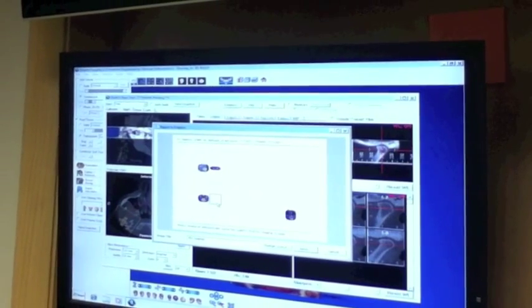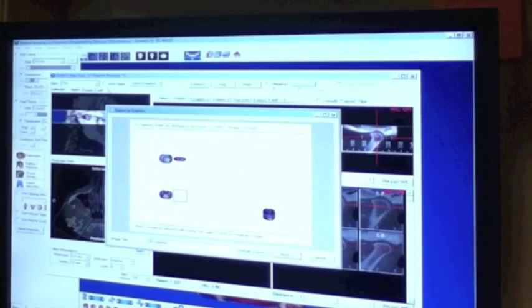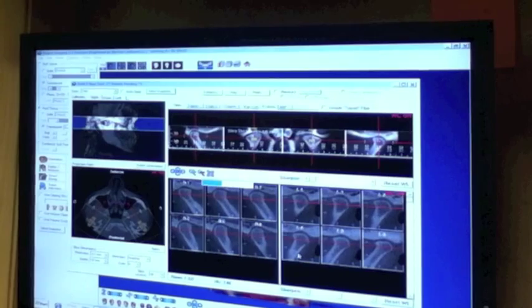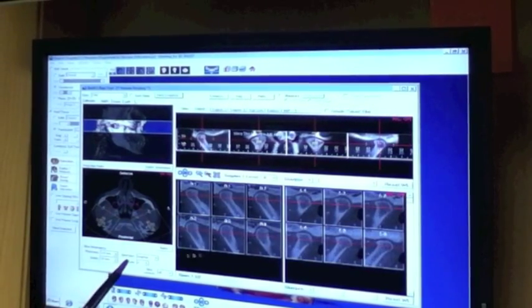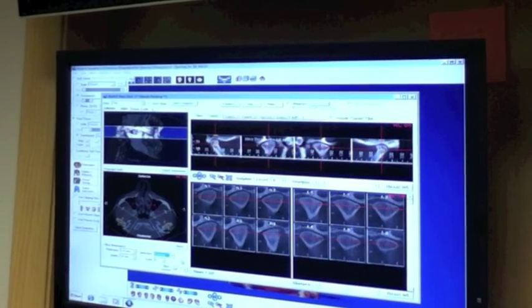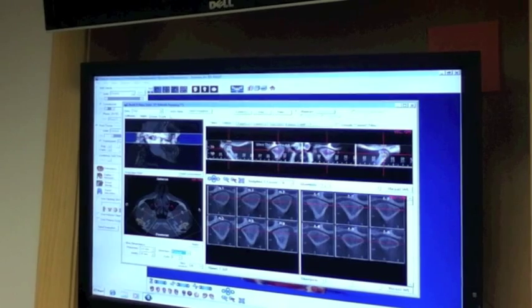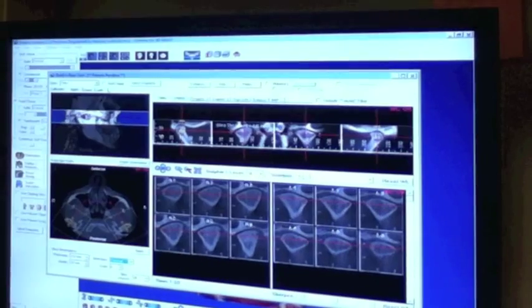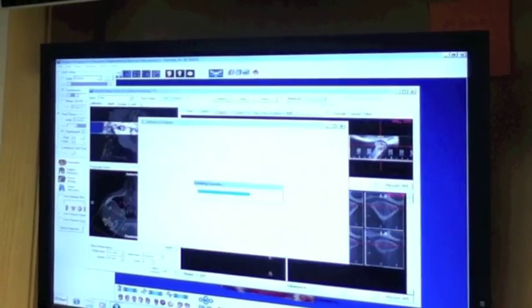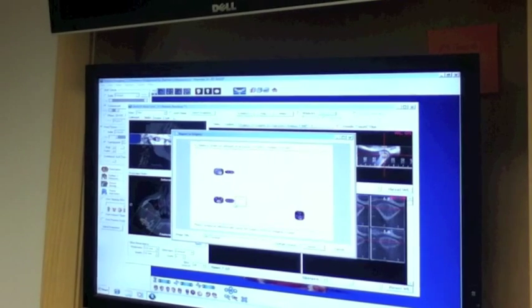This one will need to go next to the hard frontal. The 6th row down, the second box over is TMJ sagittal. After that save, you'll switch the direction of the condyles to the coronal view. And then it will be the same process of moving the yellow until you get the best picture. And then send snapshot, save to Dolphin layout, and that will be right next to the first TMJ image.